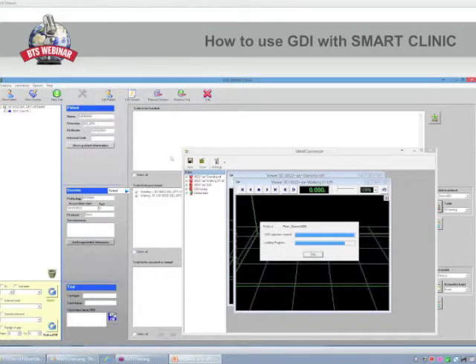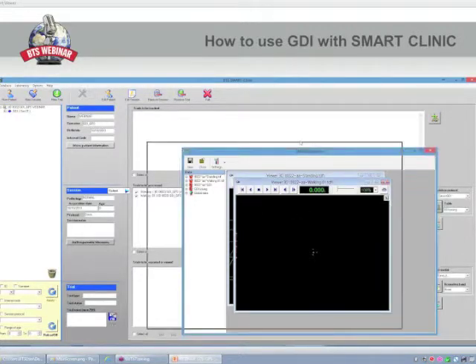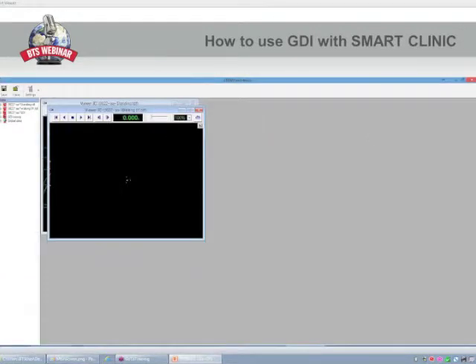Okay, so now the process is going on. Okay, now it's finished, so I'm ready to click on Save, and that's it.